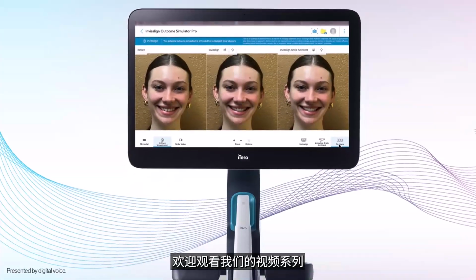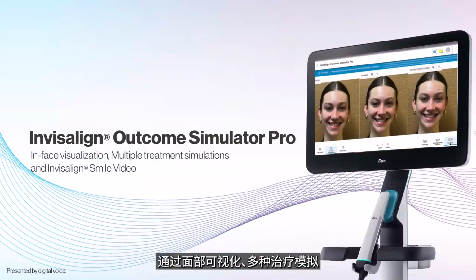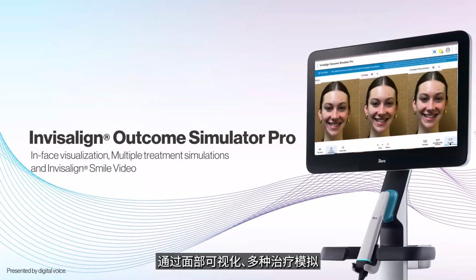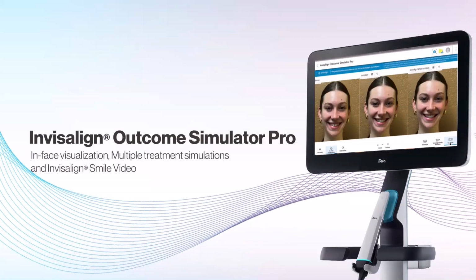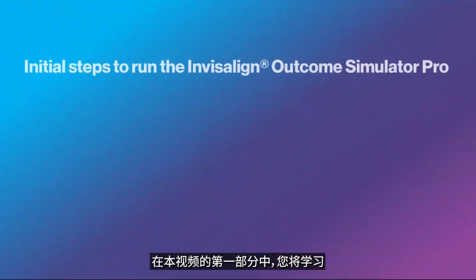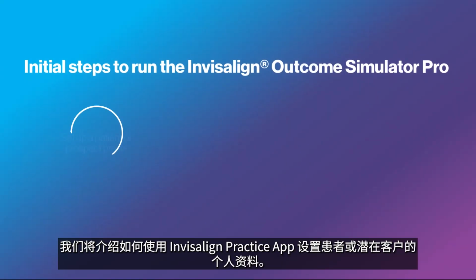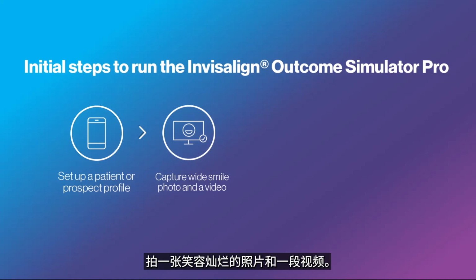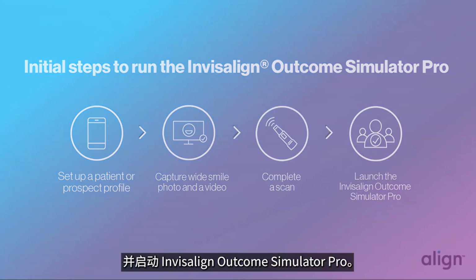Welcome to our video series on how to use Invisalign Outcome Simulator Pro with in-face visualization, multiple treatment simulations, and smile video. In this first video, you'll learn the initial steps needed to run the Invisalign Outcome Simulator Pro. We'll cover how to set up a patient or prospect profile using the Invisalign Practice app, capture wide smile photo and a video, complete a scan, and launch the Invisalign Outcome Simulator Pro.